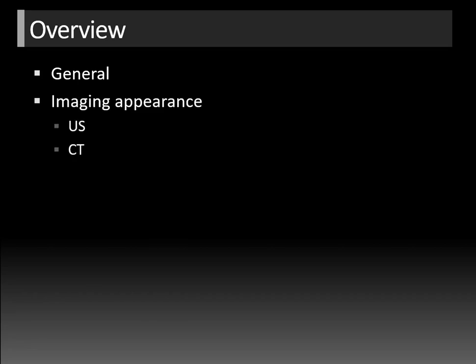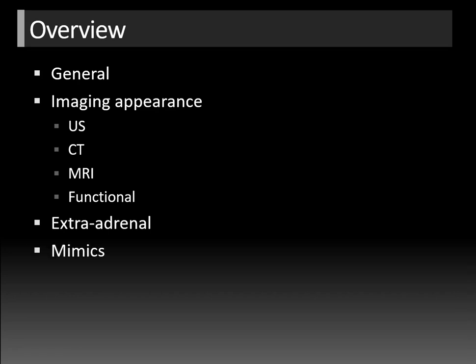So an overview of what I'll be talking about today. I'll give you a general background about pheochromocytoma, including typical clinical presentation and epidemiology, and then we'll talk about the imaging appearance for ultrasound, CT, MRI, and functional nuclear medicine studies. We'll talk about extra-adrenal pheochromocytoma or paragangliomas, and then we'll go over some mimics.